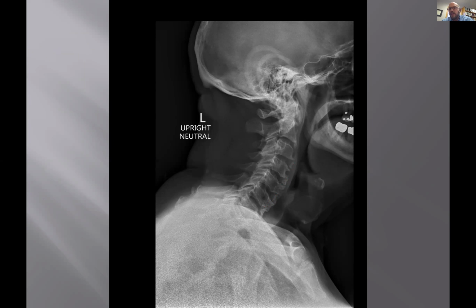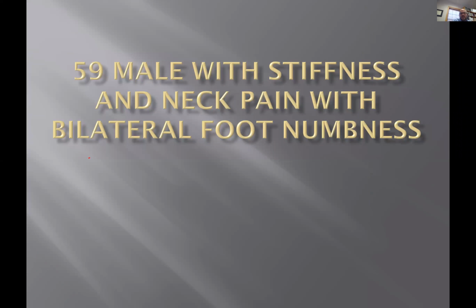Right. And is it important to distinguish DISH from just, hey guys, just call this degenerative disc disease? There's really no difference here. Does it really matter to make a distinction between DISH and degenerative disc disease? Yes, it really does. And again, it's the associations and complications. Don't forget the history here. Look at this. Bilateral foot numbness.